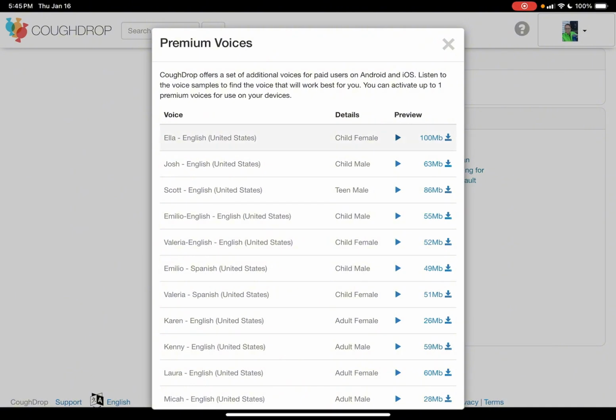Do you like my voice? This is how I sound. This is how I sound. Do you like my voice? This is how I sound.